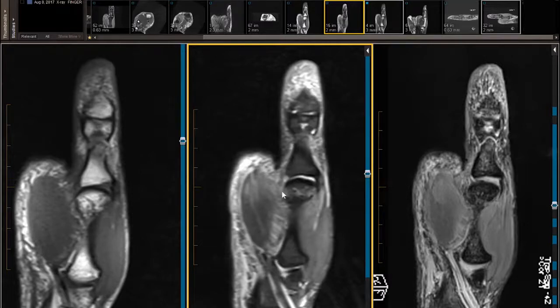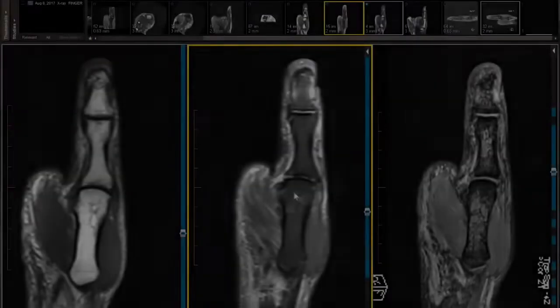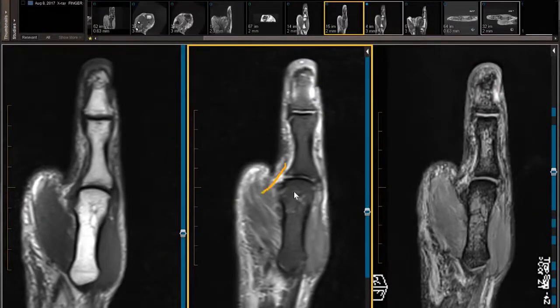Just a ghost. The next sign, if we look at the adductor aponeurosis, and I'm going to draw, here's the adductor aponeurosis, and we look at the stump of the UCL, which I see on my T1 weighted image right there, and my fast spin echo fat suppression image right there, they look like they're crossing each other. For normally, the adductor aponeurosis would be in this orientation, the UCL would be in this orientation. So the orientation has changed. I call this the crisscross sign.